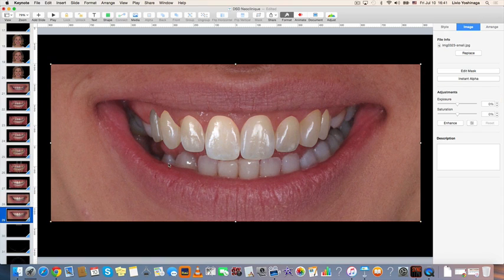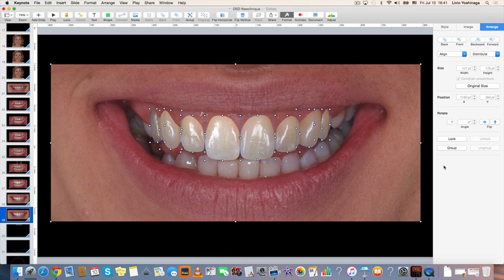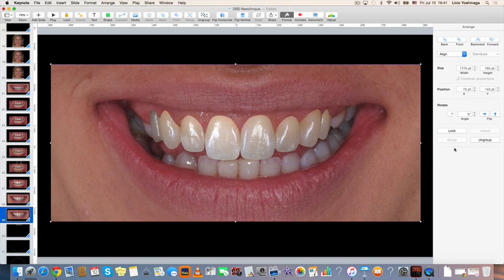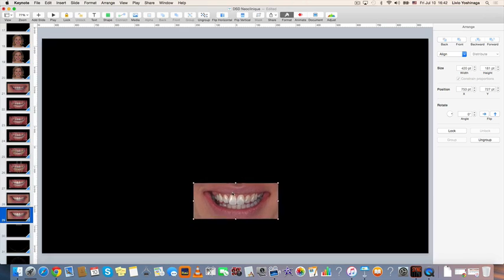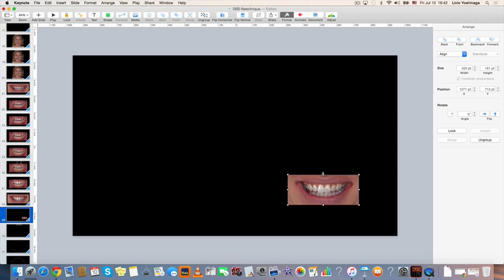Let's duplicate the slide. And now I want to see the full face. So I can select everything with the Command A. Command A is a shortcut to select everything. Command A means Command All. I can group this. I can then reduce the size of my group. I want to see around, I want to see my full slide here, so I have a reference. Where can I place Raquel? Her face is going to show up here.